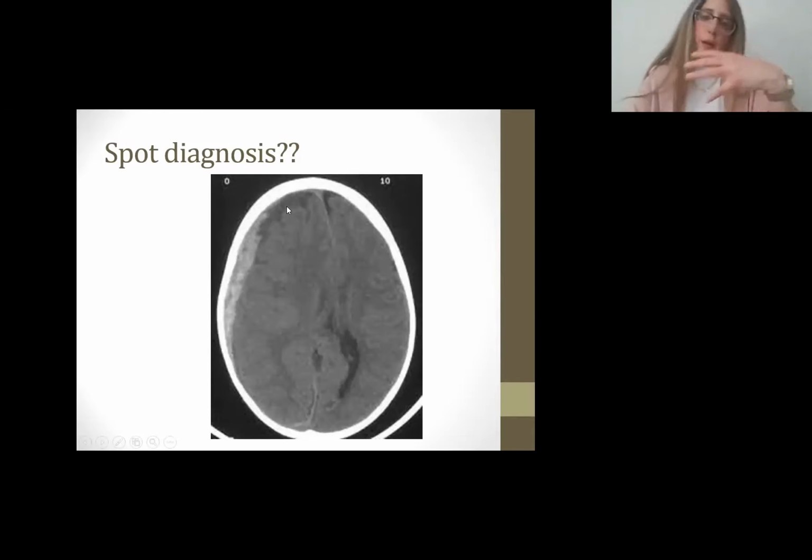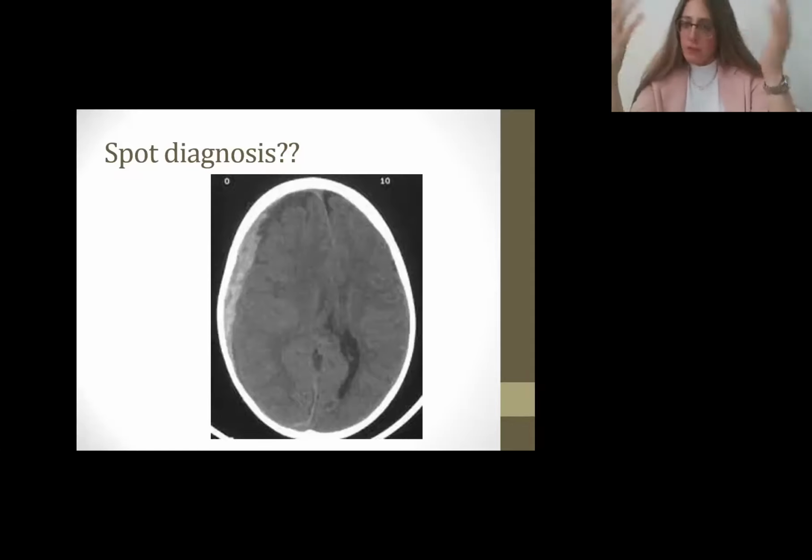This is one provisional diagnosis, doesn't mean it's 100% right, but if I saw this, I would think maybe a demented patient, repetitive fall, a boxer, shaken baby syndrome. When you shake the baby, you can end up inflicting a subdural hematoma. And if you keep doing it repetitively as a form, for example, of abuse, chronic repetitive subdural hematomas, that's also one thing they like to test you on. Repetitive subdural hematomas can come as old and new, hyper and hypo. So we say acute on top of chronic subdural.